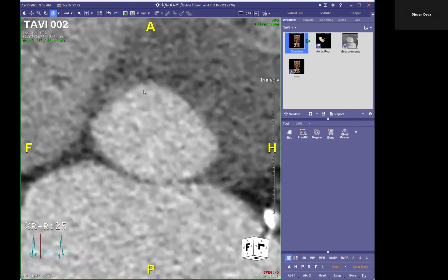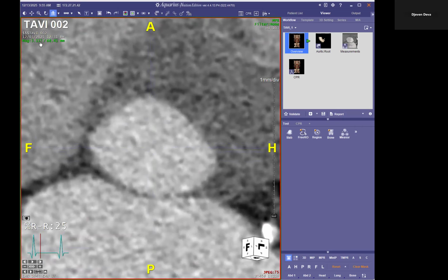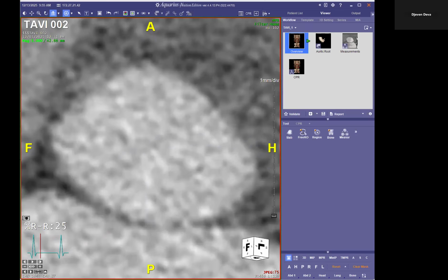Okay. Double clicking, making my zoom 5. The reason for setting a fixed zoom is so that you are eliminating one source of altered perception when you're analyzing different phases.